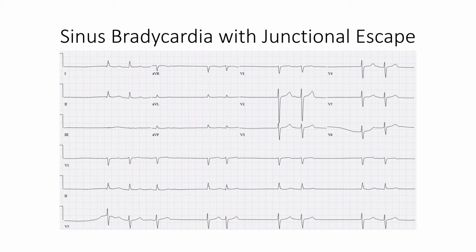We saw an example of junctional tachycardia in the previous atrial pathology section, but I wanted to bring up here that the junction does not necessarily have to be tachycardic in order to have a junctional rhythm. Here we see an example of sinus bradycardia with a junctional escape rhythm. Essentially, the sinus node is going so slowly that sometimes the area of muscle surrounding the His-Purkinje system becomes autonomous, and this muscle fires, leaving a QRS wave without any discernible P wave.